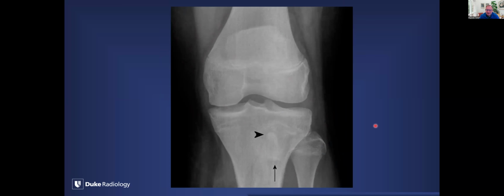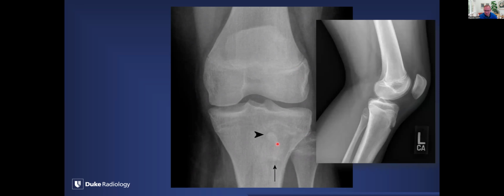Here's something, again, these are usually things that you need to see at least once or twice before you learn not to mistake these for pathology. This is the frontal view of the knee. This patient still has open physes, but as we can see here, and this is actually the tibiotubercle, right? So this just happens to be a little bit odd in appearance on the frontal view.